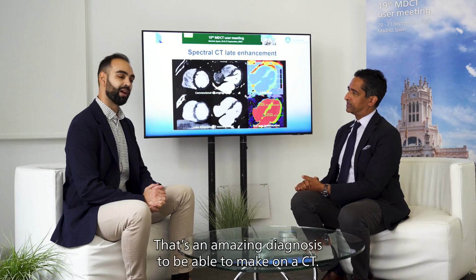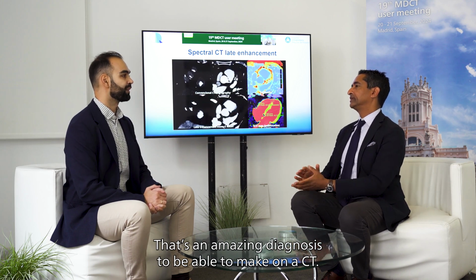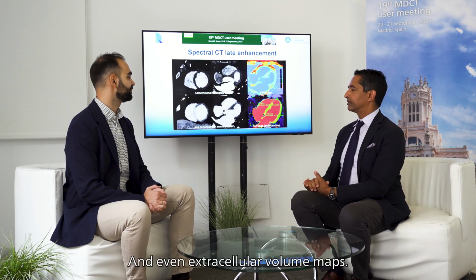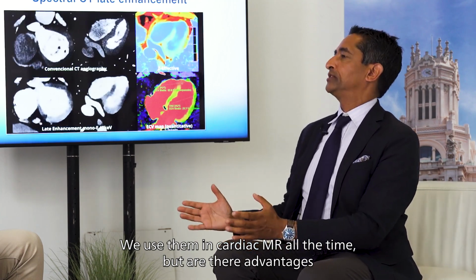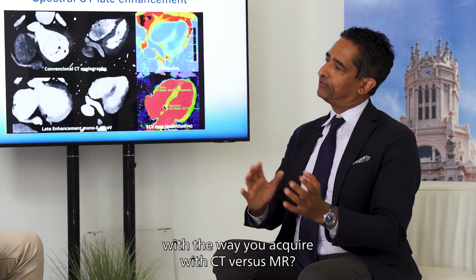So at the end, this patient had a MINOCA, a myocardial infarction without obstructive coronary artery disease. That's an amazing diagnosis to be able to make on a CT. Exactly. Even extracellular volume maps, we use them in cardiac MR all the time, but are there advantages with the way you acquire with CT versus MR?